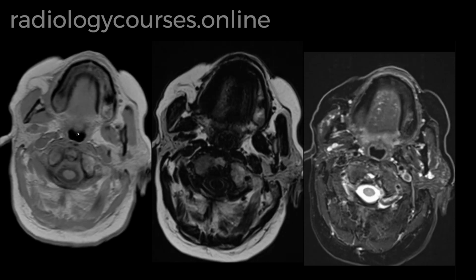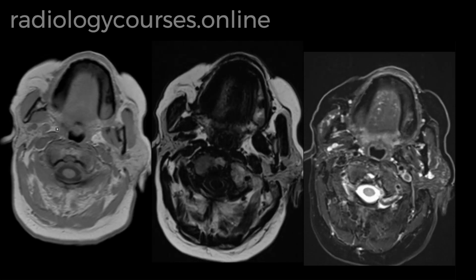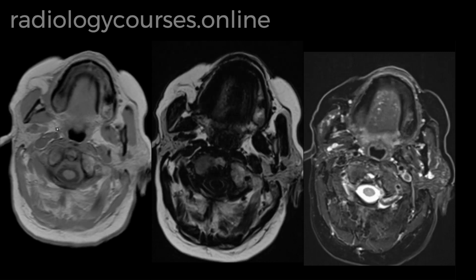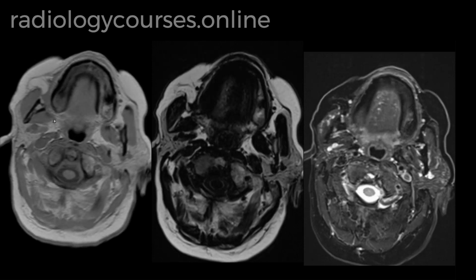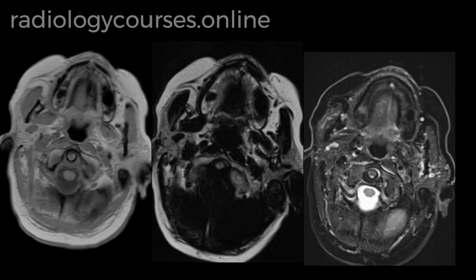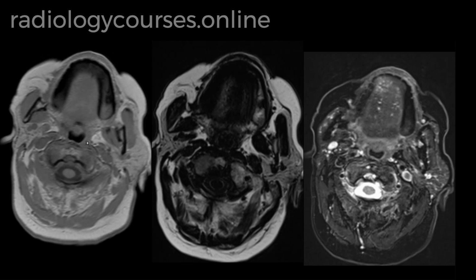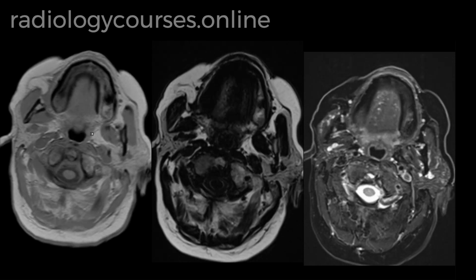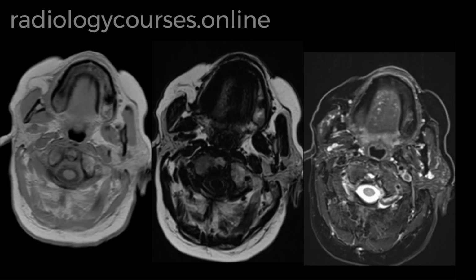We subsequently performed ultrasound and ultrasound-guided FNA, which showed this to be a mucocele. So when we compare the findings of FNA, the MRI findings correlate very well with mucocele, and we discussed this patient further in the MDT and decided to do an ultrasound follow-up in 3 months' time to see if there is any increase in the size of this abnormality. The plan was to observe and treat it non-operatively.